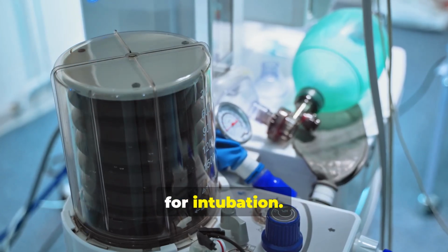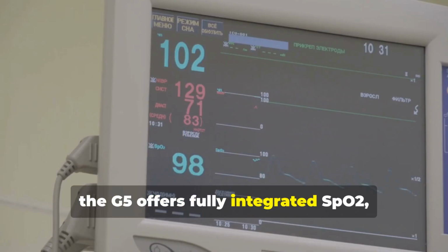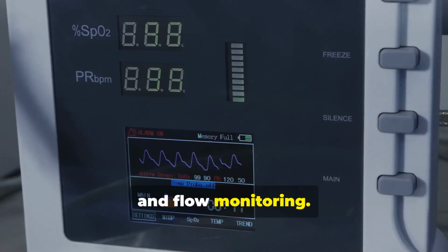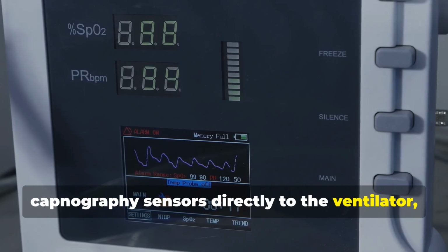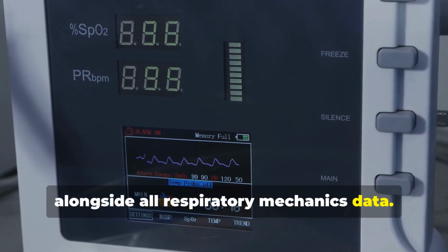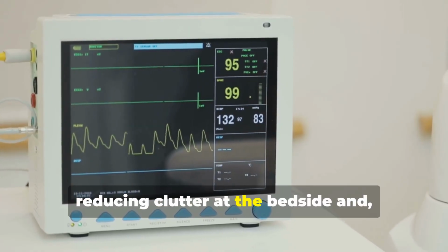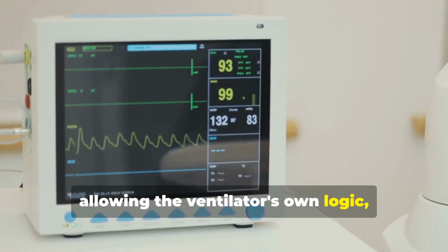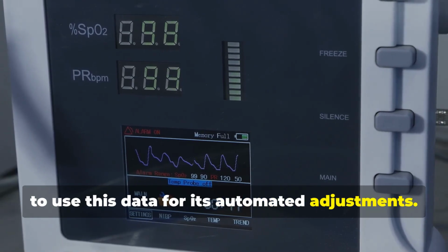To create a truly comprehensive clinical picture, the G5 offers fully integrated SpO2, CO2, and flow monitoring. By connecting pulse oximetry and capnography sensors directly to the ventilator, these vital parameters are displayed alongside all respiratory mechanics data. This integration eliminates the need for separate monitors, reducing clutter at the bedside, and, more importantly, allowing the ventilator's own logic, as in IntelliVent ASV, to use this data for its automated adjustments.